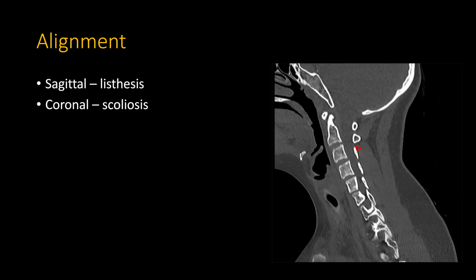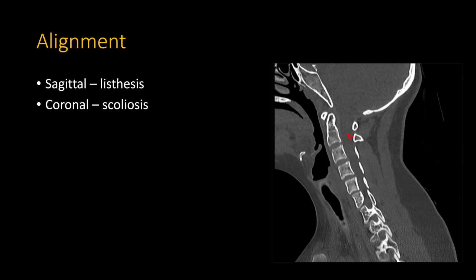A lot of times the listhesis is due to facet osteoarthritis. So when you have listhesis, you want to look at the facets and also make sure that you can account for the listhesis by seeing some facet osteoarthritis.